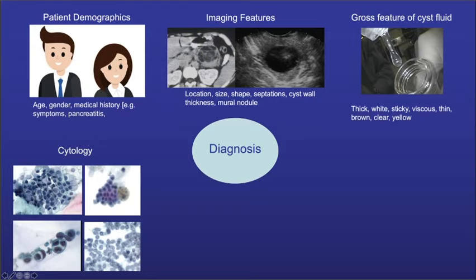Are we seeing high-grade epithelial cells that would indicate a high-risk cyst warranting resection? Do we recognize these coffee bean-shaped bland nuclei with even chromatin and little wispy tags of cytoplasm that would go along with a solid pseudopapillary neoplasm?